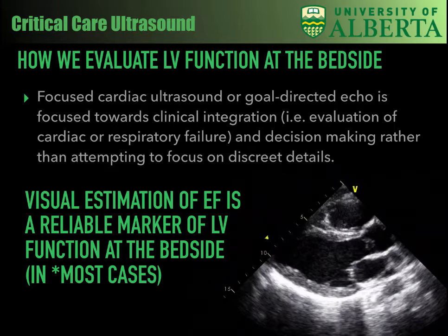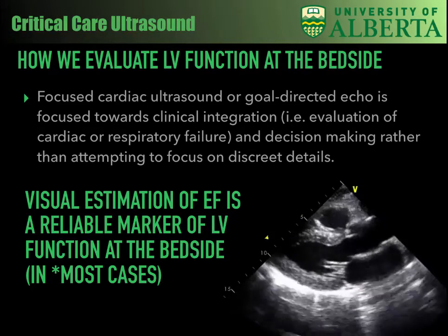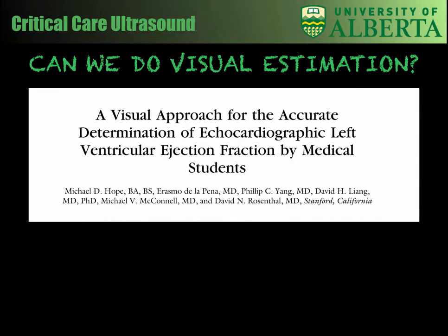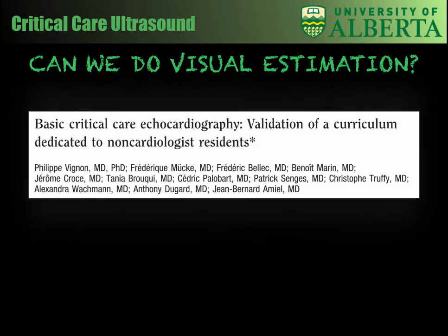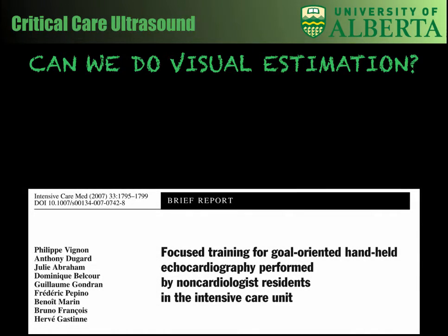Focused cardiac ultrasound or goal-directed echo is really focused towards clinical integration in decision making rather than attempting to focus on discrete details. So while having more objective measurements of EF is important, particularly in the long term, in the short term, having an idea of grossly categorizing LVEF is arguably more important. There are multiple studies showing that visual estimation can be done even after a relatively short training period.